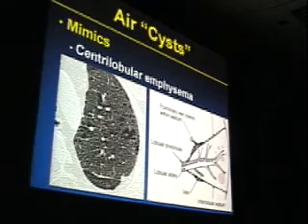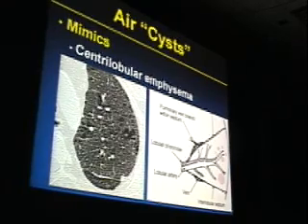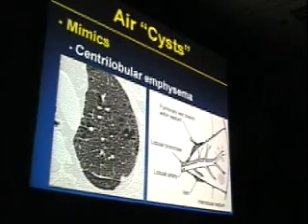It's very important that we differentiate emphysema from some of the cystic lung diseases because emphysema will be over 100 times more common than the variety of cystic diseases we've just discussed. And you will encounter many, many cases of emphysema in your practice to maybe 1 or 2 cases of EG or LAM in your practice. Centrilobular emphysema begins as little punched-out lesions along the centrilobular artery and bronchus. And when we see it like this, it's really not that big a deal.